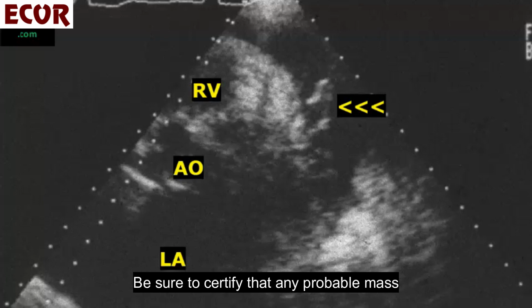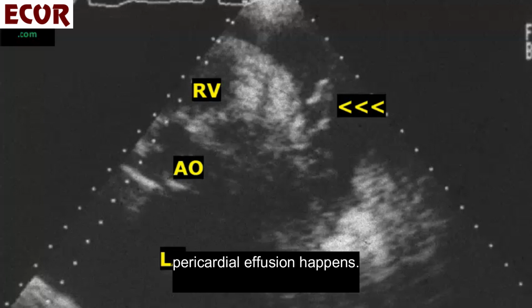Be sure to certify that any probable mass at this region, which corresponds to the place of the left atrial appendage normally but that you do not identify in patients without pericardial effusion, may be this structure when a pericardial effusion happens.